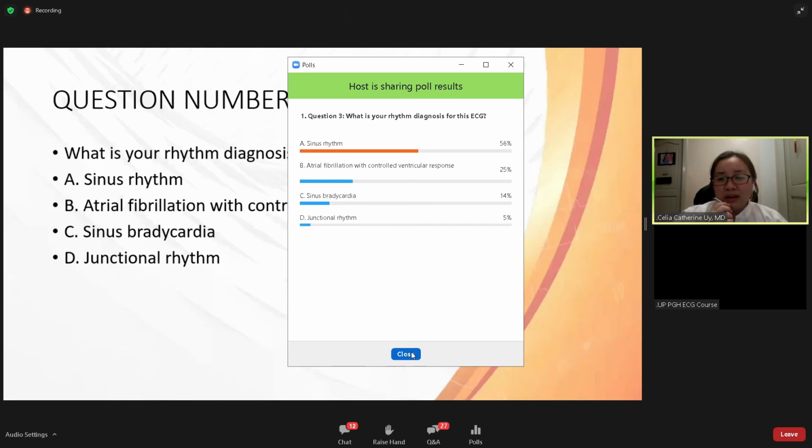About a quarter of you, 25%, answered atrial fibrillation, while 14% of you answered sinus bradycardia and 5% answered the junctional rhythm. But the correct answer is letter A, sinus rhythm.